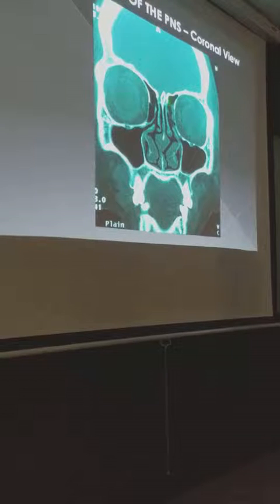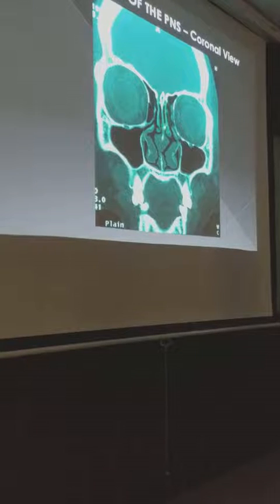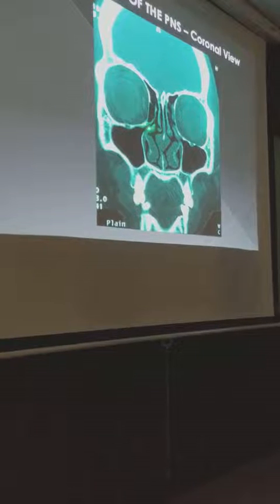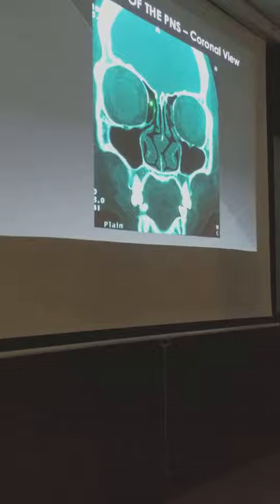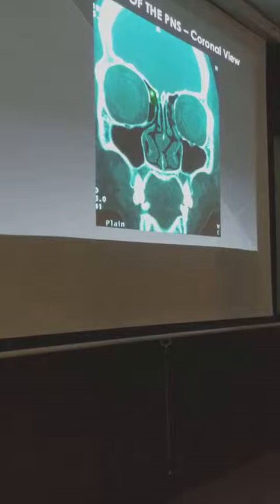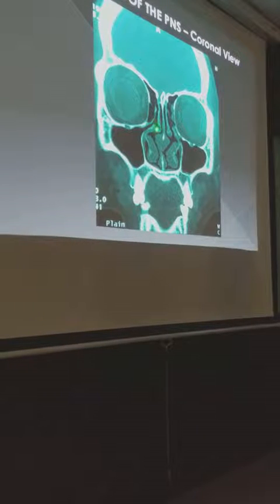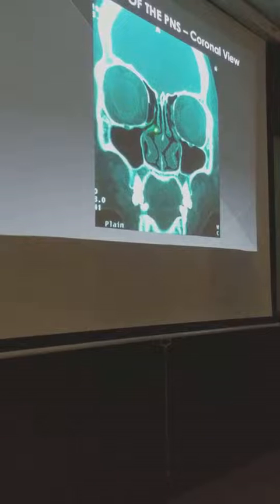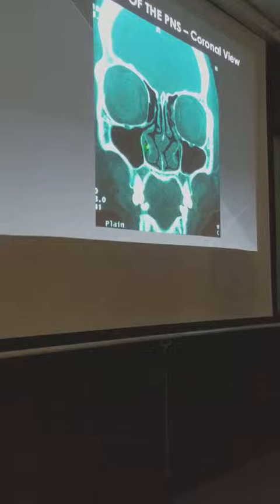And this is the lateral lamella of the cribriform, and then that's the crista galli. Middle turbinate is here. This is the uncinate process. So this is the ethmoidal bulla. You have the lamina papyracea, suprabular recess. Okay. So if you notice here, okay, anterior and inferior to it would be this uncinate process. I told you that the attachment superiorly is variable.